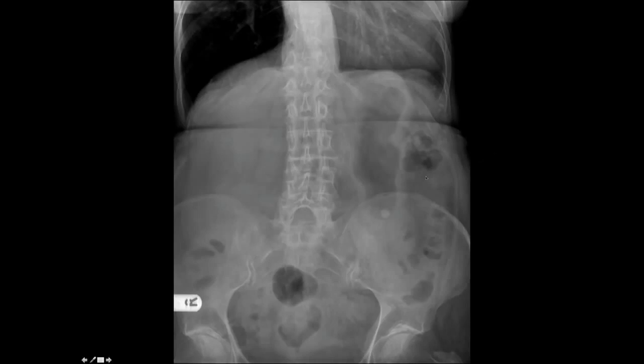There is this picture again, abdominal X-ray. So if you look here, bowel gas pattern again, very much normal. And this is a bowel gas shadow here, and well-defined opacity. Most of the time, if you spot any well-defined opacity, think about man-made stuff. That's pretty circular then, yeah? Very nice. So that's a tablet in the stomach. And that's the stomach shadow, gas shadow. So A and B, bowel gas and additional opacity.